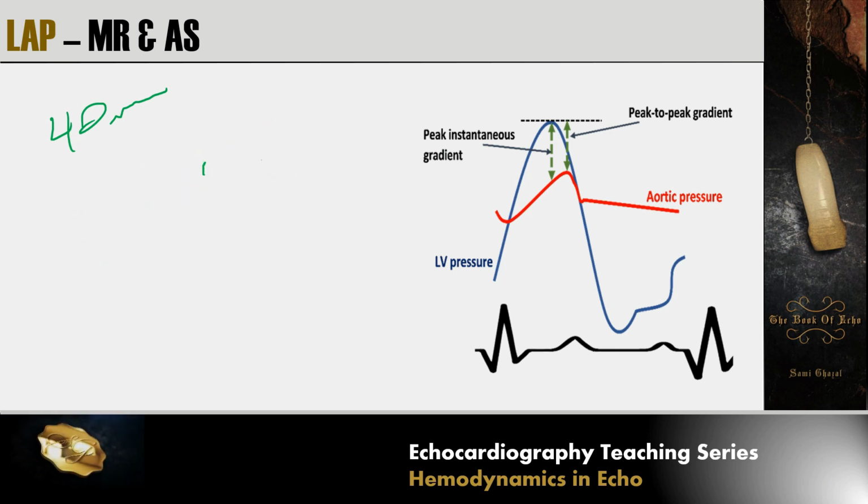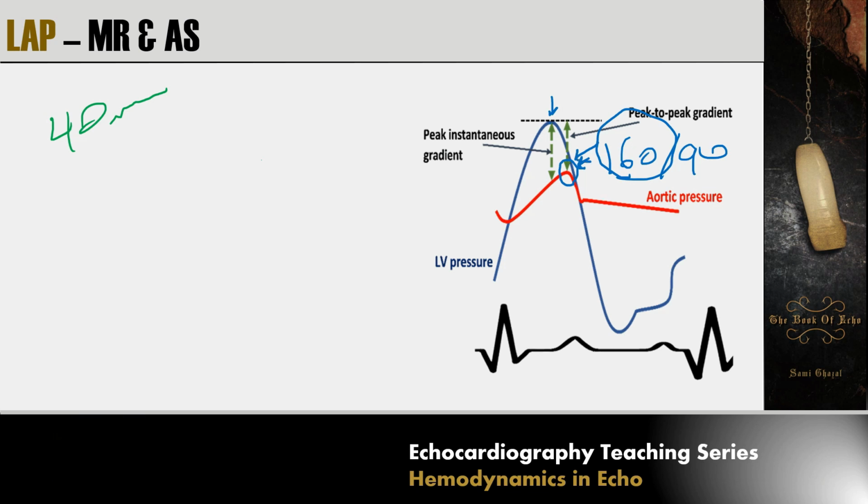The problem is what we measure in systemic blood pressure is here. It will peak later in the presence of aortic stenosis. It will peak later than the LV. So this is the LV peak here, and this is the aortic peak. What we measure, let's say this patient's blood pressure is 160/90, so we measure it here at this point. This is the 160 here. By doing continuous wave Doppler, this is the gradient that we measure.